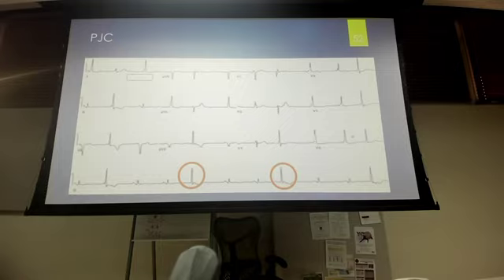This bottom rhythm strip, this 10-second rhythm strip. Okay, again, I do see we have very low voltage QRSs, but in between those low voltage QRSs, if we march this out from here, we would expect something just right at the end of here. But this is occurring a little bit earlier. It's narrow. We don't have a P wave here. Same thing here. We don't have a P wave. So this patient is having pretty frequent premature junctional contractions. Very narrow QRS and no associated P wave.